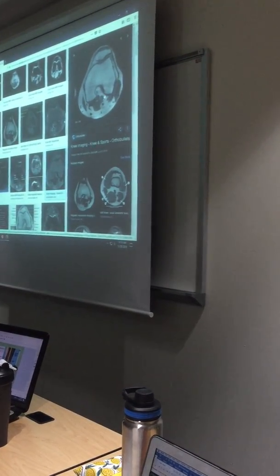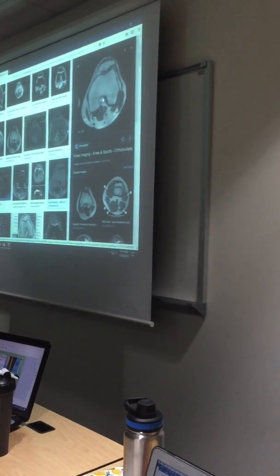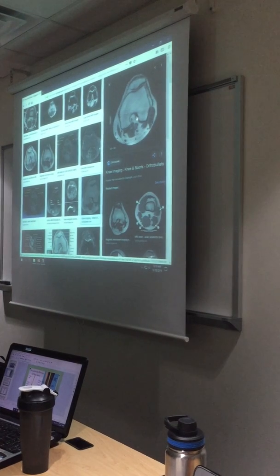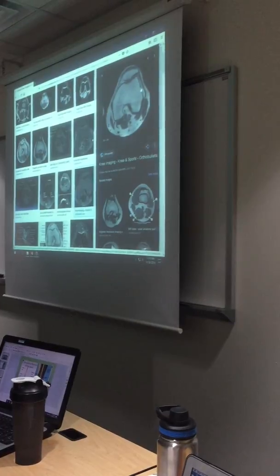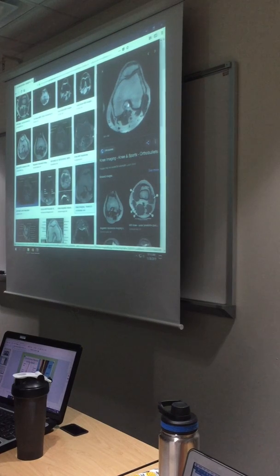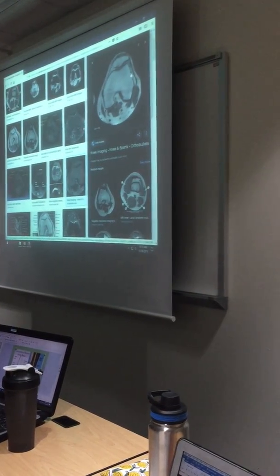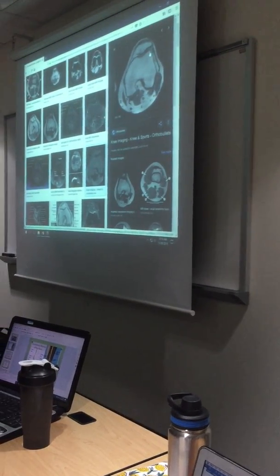And if I see a ligament, this dark band running along the tunnel, what do you think that ligament is? It's your ACL. So when I see this dark band running alongside this tunnel, is that lateral or medial? It's lateral. Because when we are setting up our sagittal slices, we're going to be paging through the axials that we took. And then we want to make sure we angle with your lateral condyles, which is here.